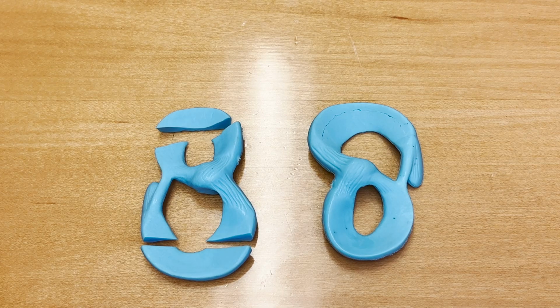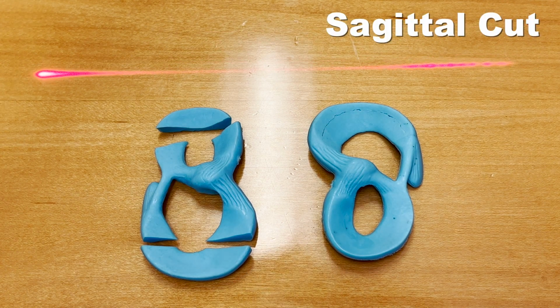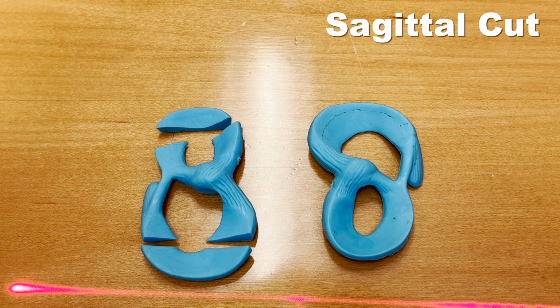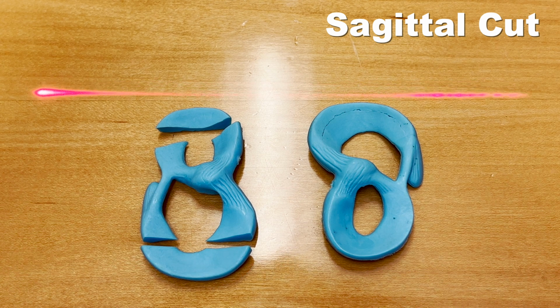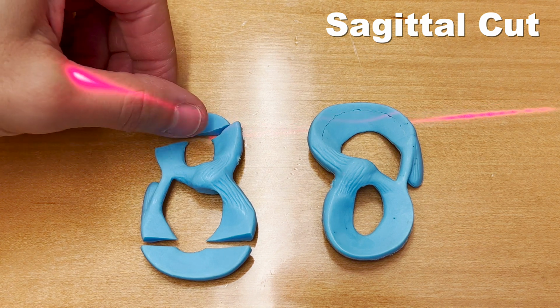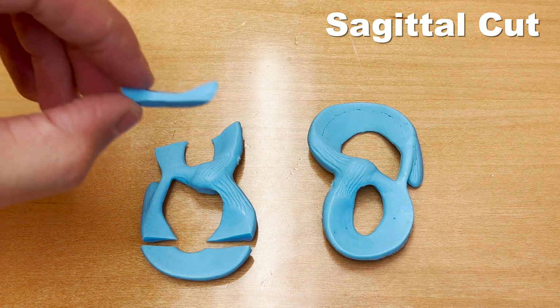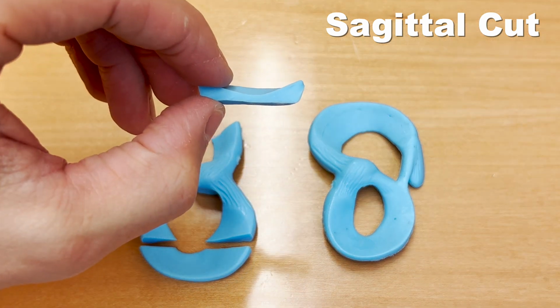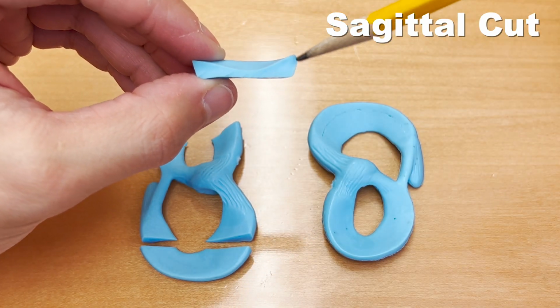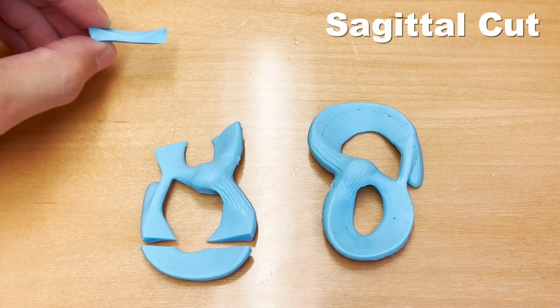Okay, now we're going to go through a different orientation. This is going to produce a sagittal image. There's our laser line just like that, and we're going to move from this direction down through the meniscus like this. On our cut meniscus on the left, you can see how we've made a cut just like that. If we flip the cross section up here and take a look at it, we can see how the meniscus would look on the MRI. It has sort of, I don't know, approaching maybe a bow-tie look to it.